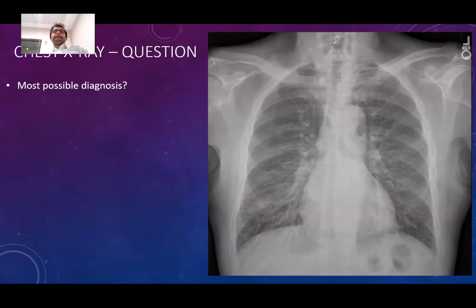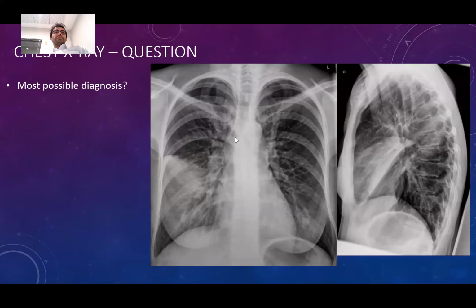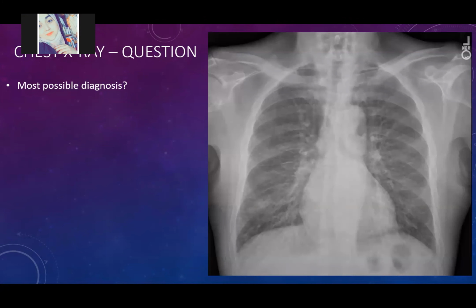Thank you, doctor. Okay, let's come to this one. Does anybody want to have a word? In the previous slide, there was no consolidation. Yeah, let's look. Here maybe, right? Here maybe, but most prominently interstitial, yes. Not very prominent consolidation.